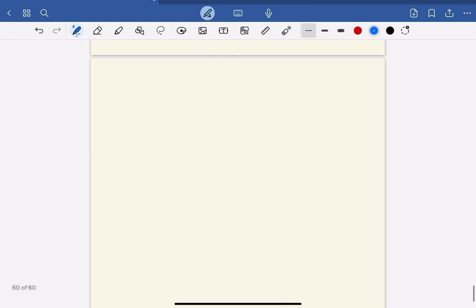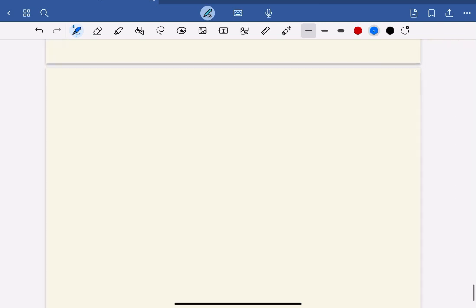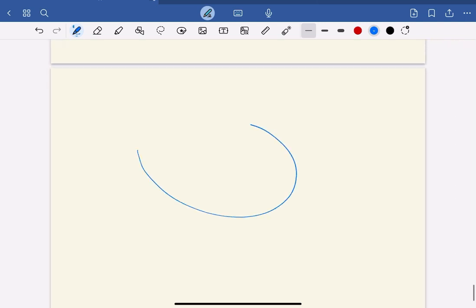If I want to make you understand with a pictorial diagram, let's suppose these are your ventricles. This is the left ventricle, this is the right ventricle. So this is the apex of the left ventricle, and our right ventricular apex is here. So here is the focus which is generating the PVC in the given ECG.